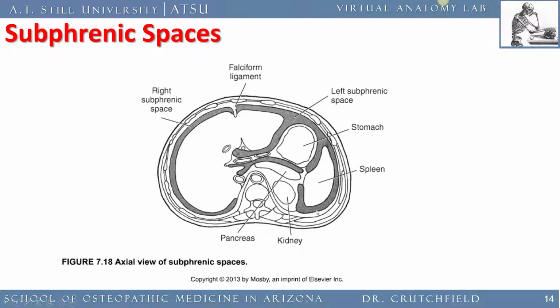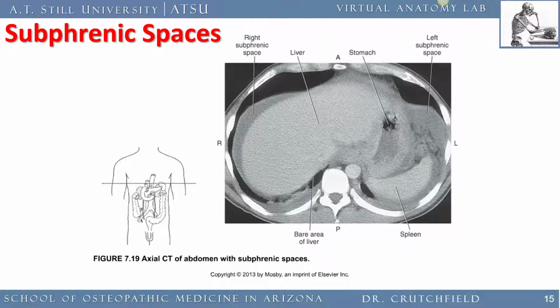So if a splenectomy is performed by a surgeon for any reason, trauma, disease, cancer, lymphoma, doesn't matter, we have to clip those short gastric vessels. So again, pancreas, and behind the stomach is the lesser sac in here, just showing us where there are spaces where pus and blood and fluid can be seen and palpated. So this is a really good cross-sectional CT image showing fluid within all of those peritoneal spaces.